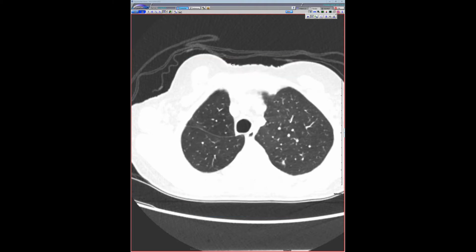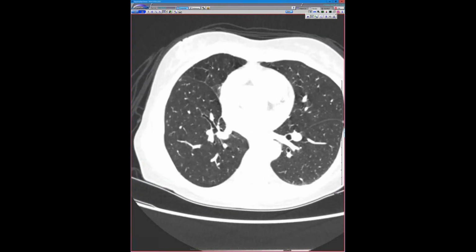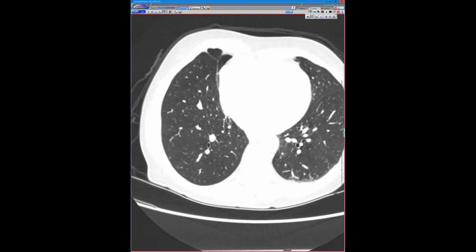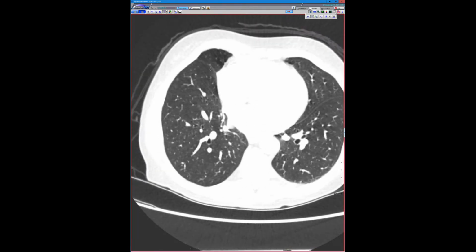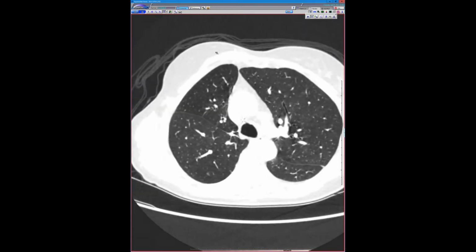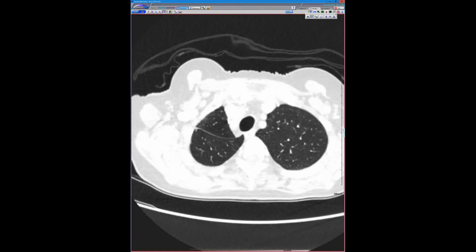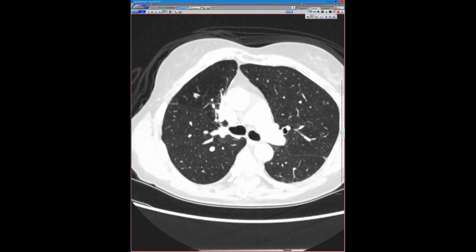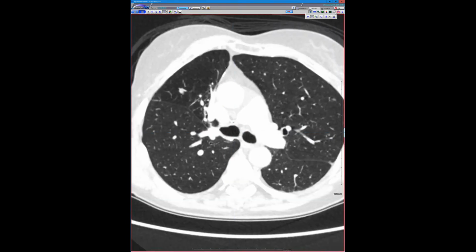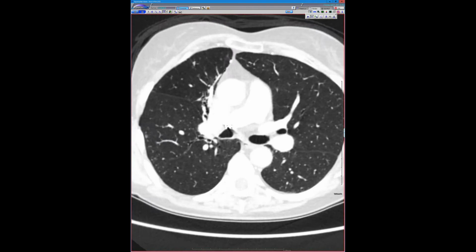We often see AH associated with multifocal adenocarcinoma, but this patient also had the meningothelial-like nodules and multiple carcinoid tumorlets superimposed on it. So it was not a fun case to follow up because I was trying to determine what was what, but eventually I just said it's not really changed over many years, and just keep following those subsolid nodules that appear a little bigger.